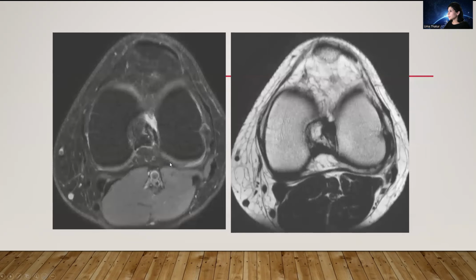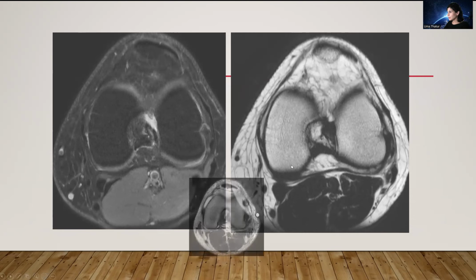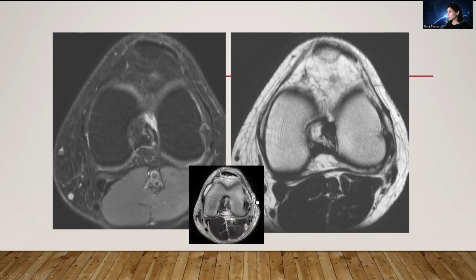As we go more distally, you can assess the popliteus tendon come in here, the origins of the cruciate ligaments, and this is more at the mid portion, but the cruciate ligaments here, with this being the ACL and PCL right here. You can also assess for Baker's cyst between the semimembranosus and medial gastrocnemius tendons, as well as the medial and lateral patellar retinacula, and this posterior capsule, which is also better outlined with the contrast here on this non-fat sat image. And this is just showing what a posterior capsular sprain would look like. It's completely frayed here as opposed to a normal posterior capsule.